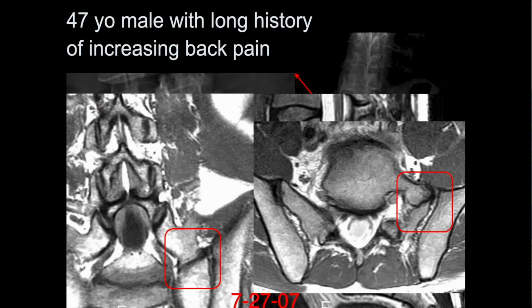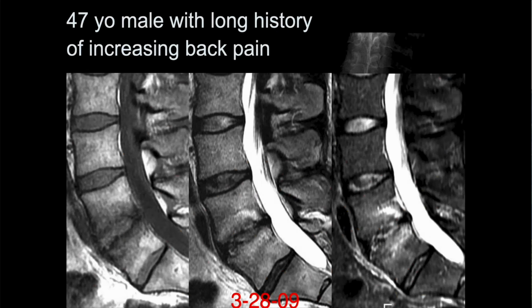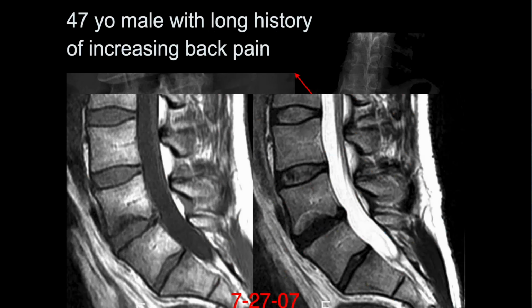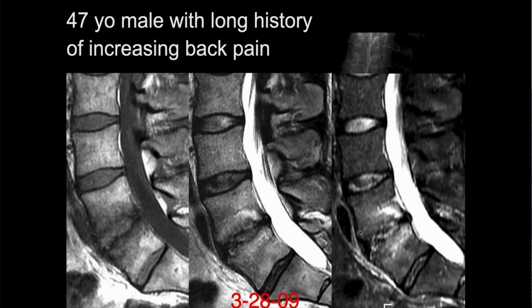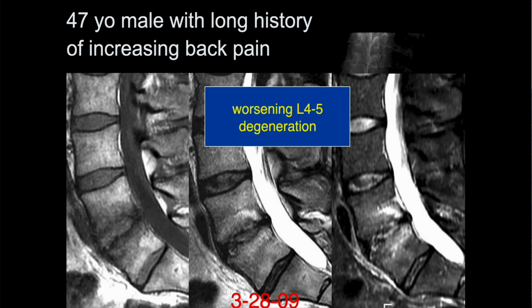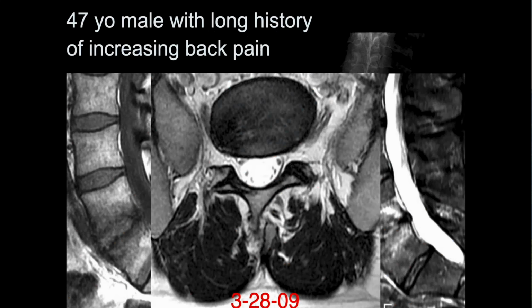The patient came back 2 years later with increasing pain, and this is what it looked like 2 years later. So here's 4-5 at this time. Here's 4-5 as it was before. So it's progressed over 2 years to more degenerative disease. And this is producing abnormal positioning of the spine, and we have overlap between the 4 and 5 spinous processes. This can also produce pain dorsally.